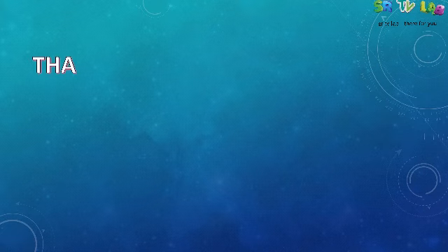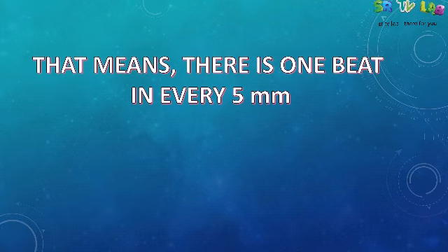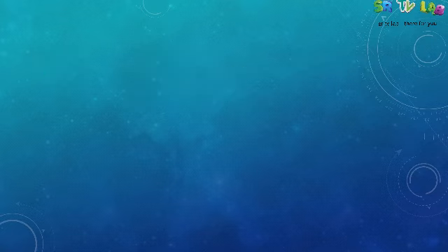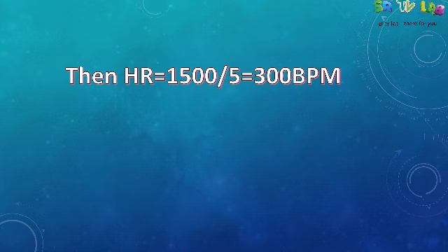Therefore, this means there is 1 beat in every 5 millimeters. You remember, the big square has 5 small squares, and every small square side equals to 1 millimeter. Then, what do you think will be the heart rate? Let's see. So therefore, the heart rate is going to be 1,500 divided by 5, which is equal to 300 beats per minute.